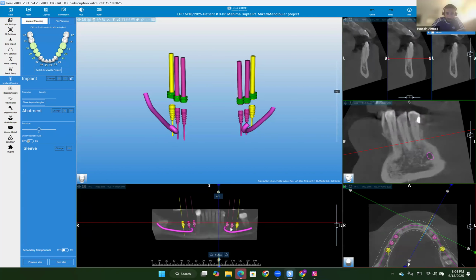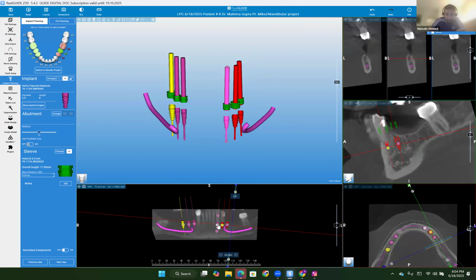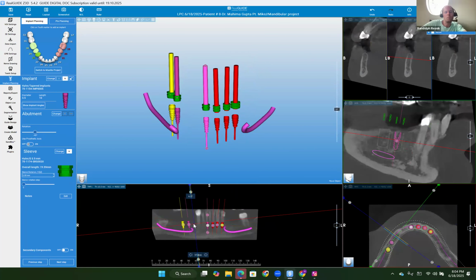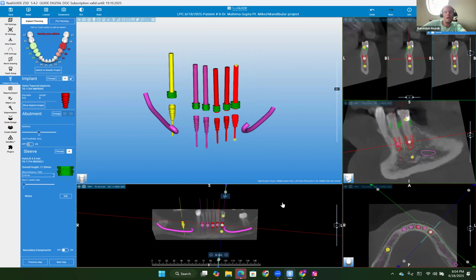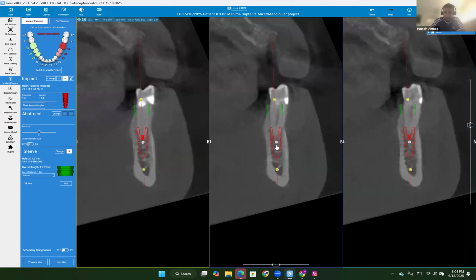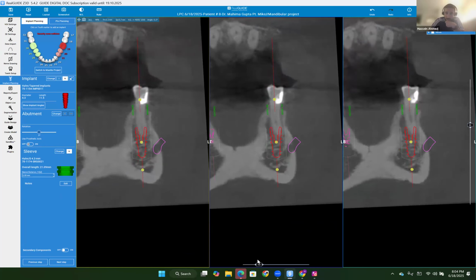So I'm going to switch on my implants, but I planned it a little bit differently, Dr. Resnik. I planned them for bridge work, so I'm going to start moving things a little bit anteriorly. Just plan A, C, and E. Yes, sir. So here's the E position, Dr. Resnik. The size I've got right now is a 4.3 by 11.5 millimeter long implant, sir.